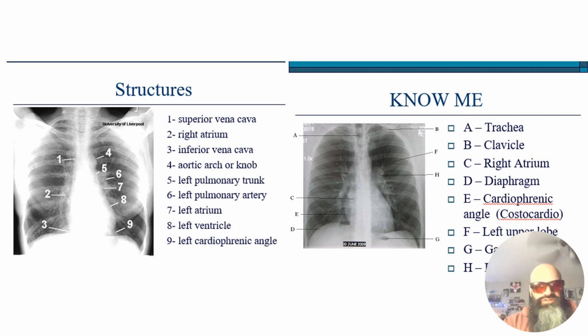So as I mentioned earlier, make sure you study these normal anatomical structures on your chest X-ray. I have a few here that are numbered and they have a legend as well.